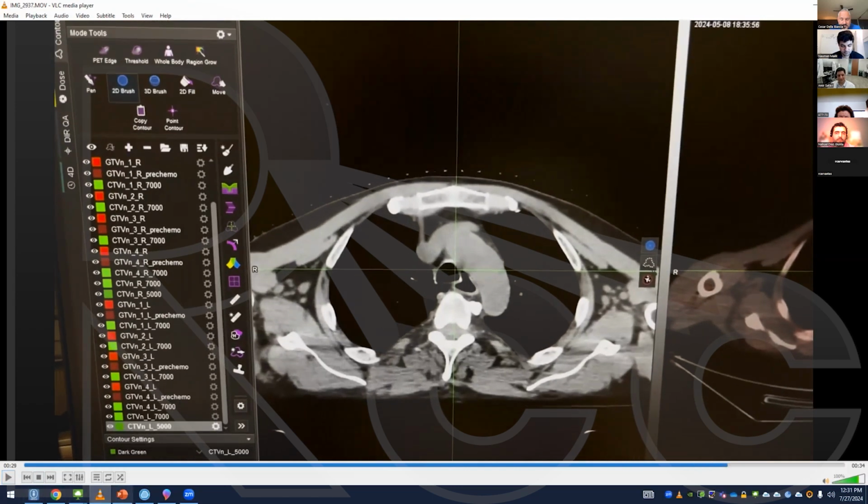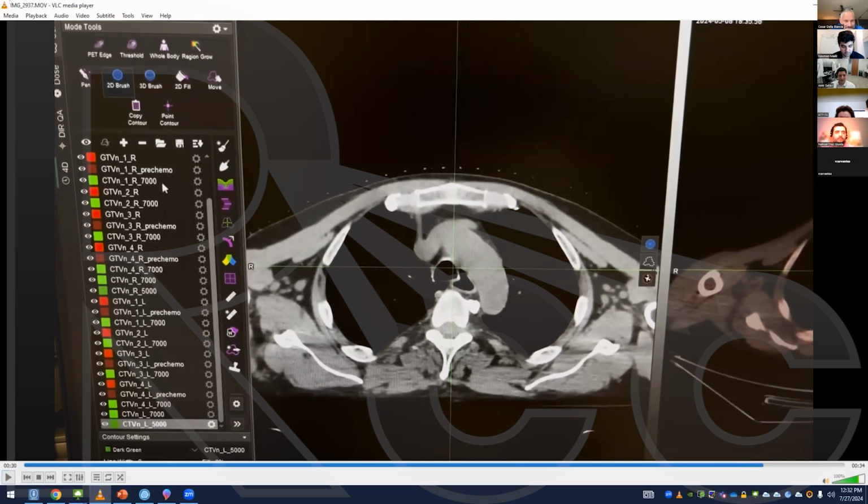I'll pause the video here. At Princess Margaret, where Dr. Malik works and where I trained, we are very meticulous with our contouring. So we label every structure, pre-chemo, post-chemo, GTV, CTV. Other centers are not as meticulous, and I think they enjoy much faster contouring than Princess Margaret, but there is some method to the madness and it can be enjoyable. So I did this contour recently. Now let's look at the plan.